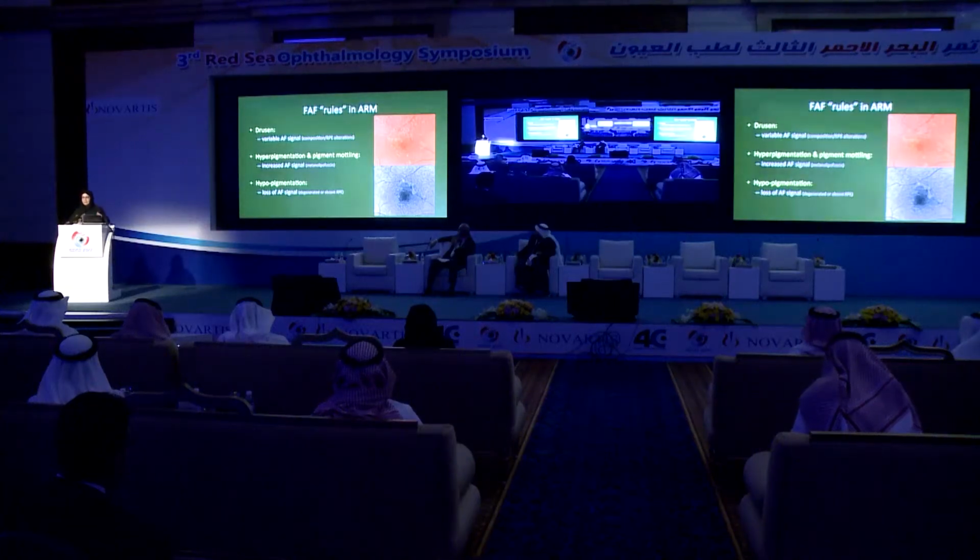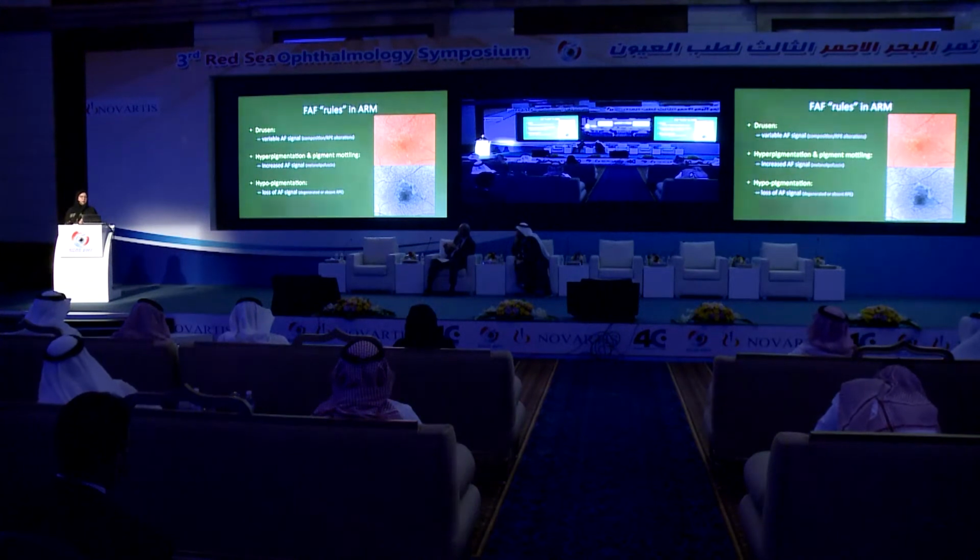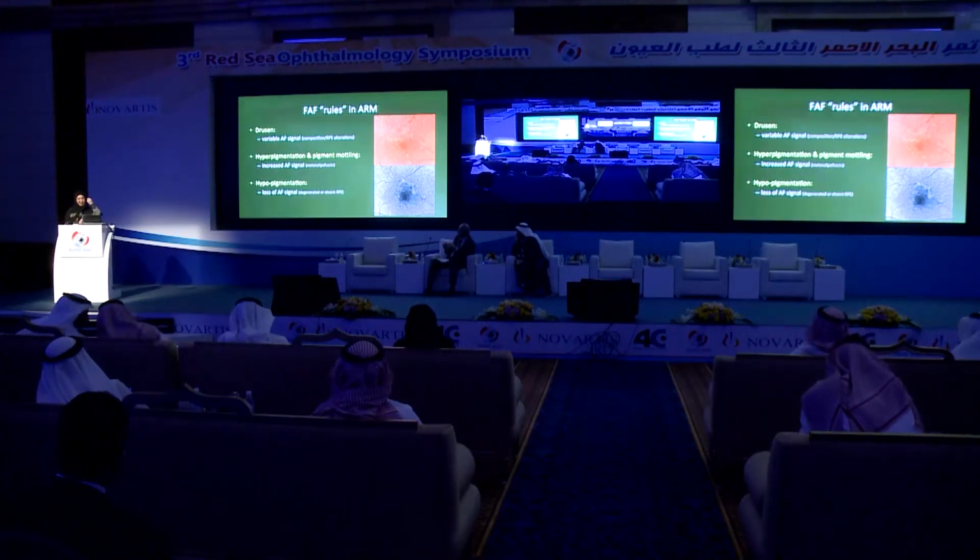So I'm not going to go over this, just to show you that it's an imaging technique that can help a lot in understanding a little bit more about the disease, and it maps the function of the RPE, so it'll give you an idea about the health of the RPE. It's very important as a marker in trials, for instance, if you're testing a medication to see if it decreases the progression, and since you have a marker for progression, this is a very useful technique.